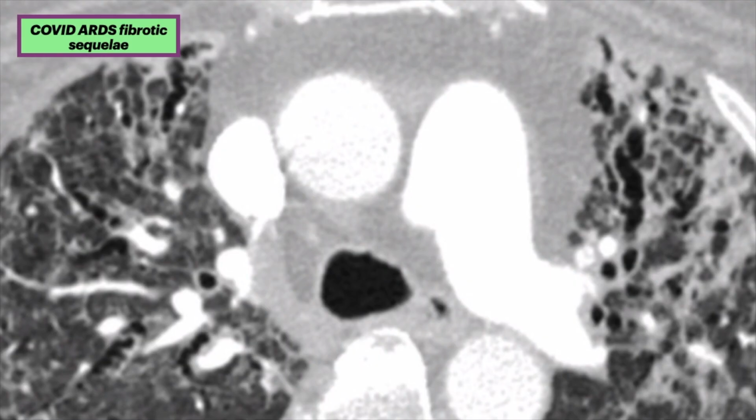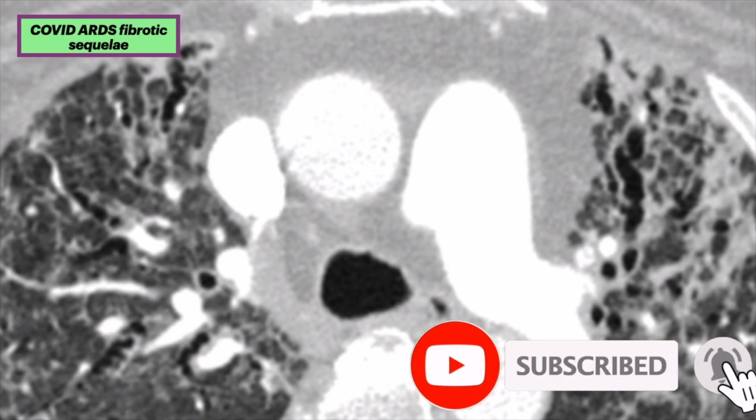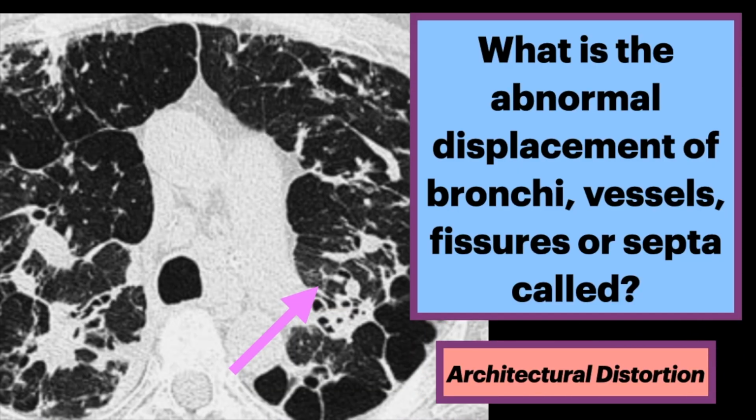Our last case is one of COVID ARDS and the fibrotic sequelae of it. This axial CT of a patient who suffered from this shows asymmetric left greater than right architectural distortion, reticulation, and traction bronchiectasis, which is consistent with fibrosis as a sequelae of ARDS, acute respiratory distress syndrome. You now know a ton about architectural distortion.